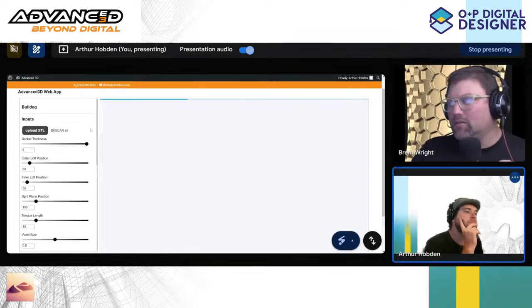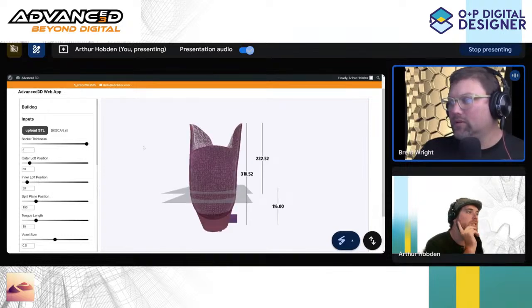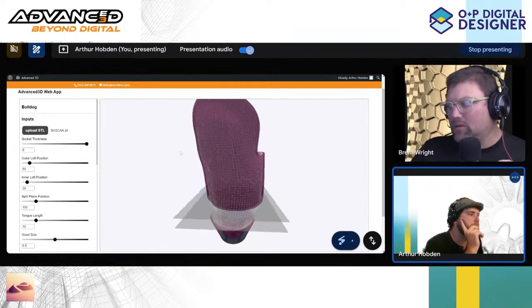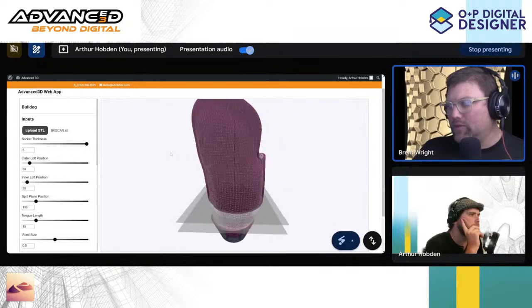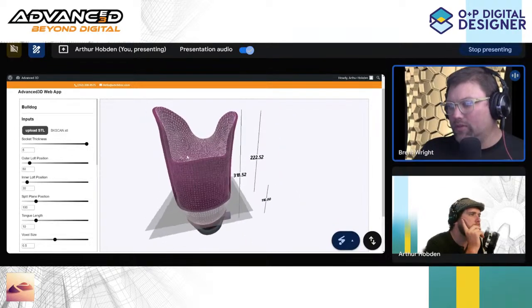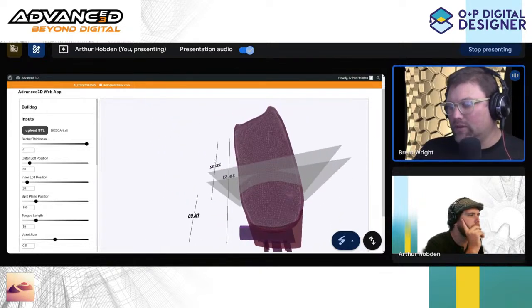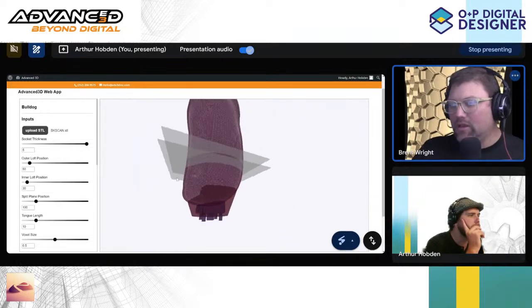Okay. And then we'll, hey, there it goes. Awesome. Okay. So what are we looking at? Yeah, so this is your socket aligned on the Bulldog, which looks like it did everything correctly.